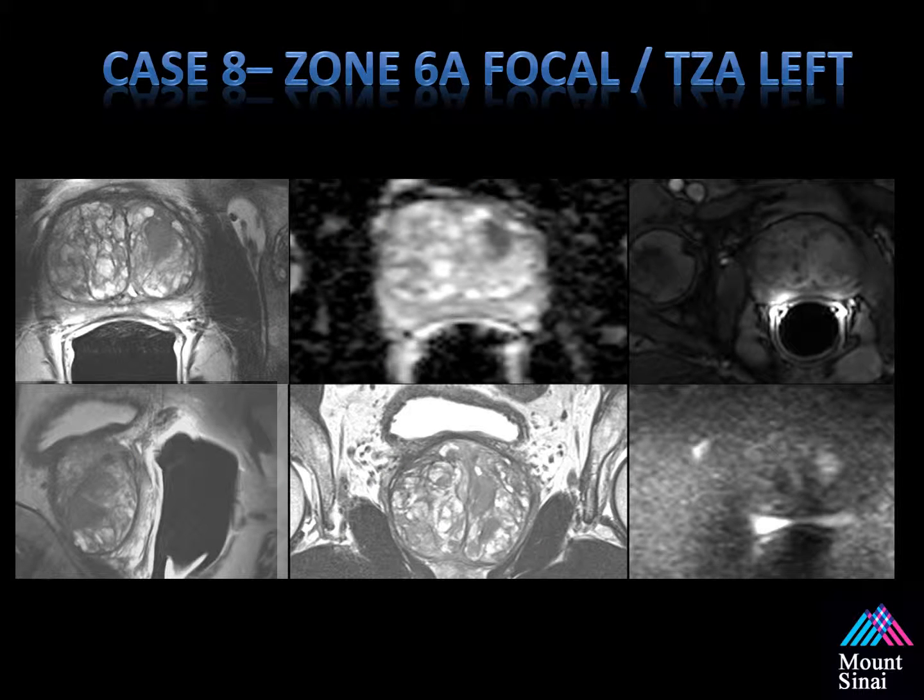Can you see the lesion? Please look at the ADC map. Maybe that helps you if you look at that first, and then look at the T2 weighted axial sequence. And then look at the lower right B2000. Do you see all the abnormality? It's very clear. This is the T2 abnormality. This is the ADC map. Enhancement wasn't that abnormal, however the B2000 was positive right here. This may be the lesion in the coronal as well as a lesion here in the sagittal plane.